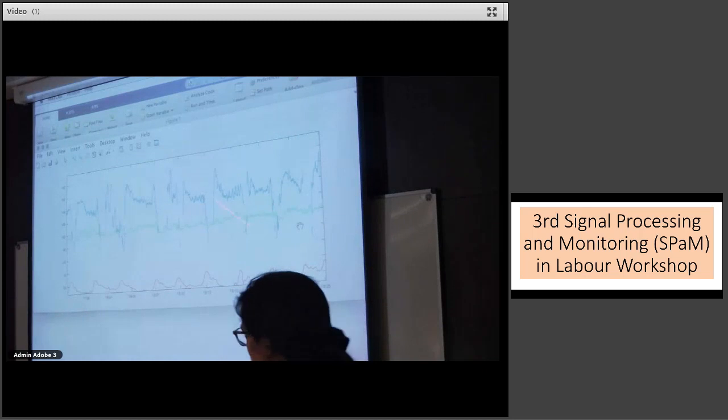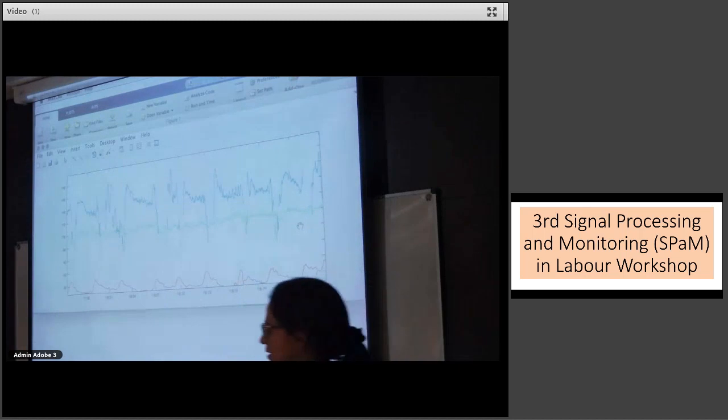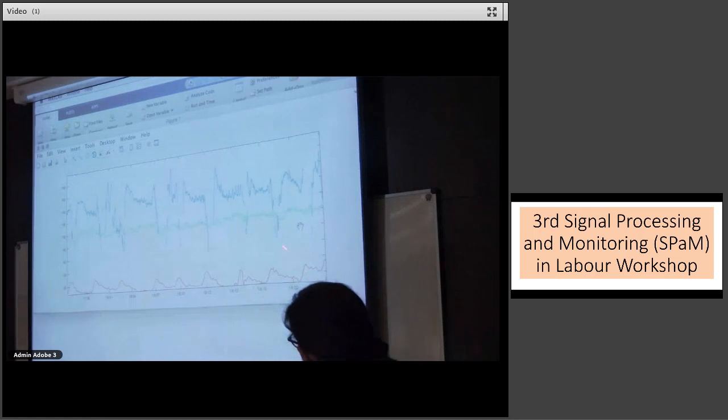Okay, but you would stop oxytocin? Well, yes, because the duration of those contractions is quite a lot. Okay, is she progressing well? And yet, any information? No idea. That's fine. So definitely stopping oxytocin when you get this sort of pattern. And I agree that the variability for us is reassuring.